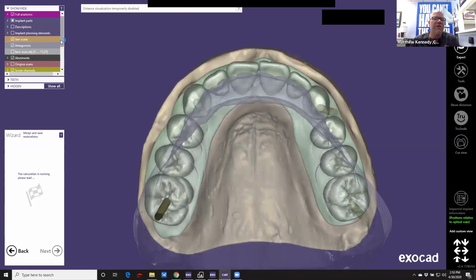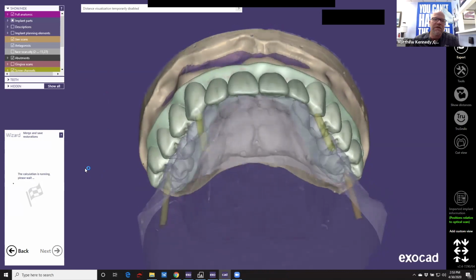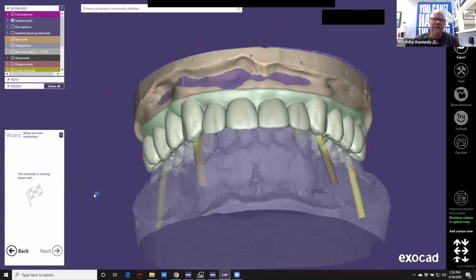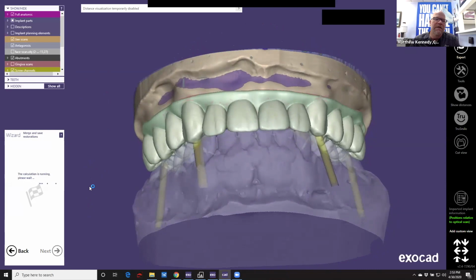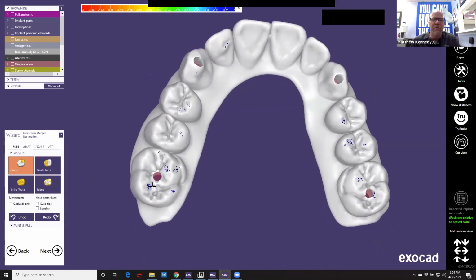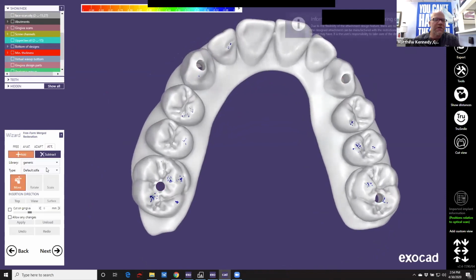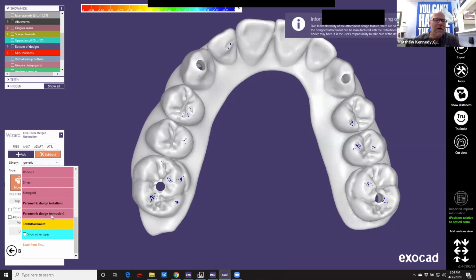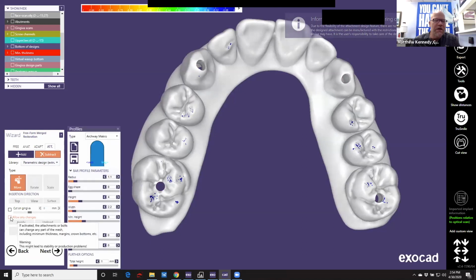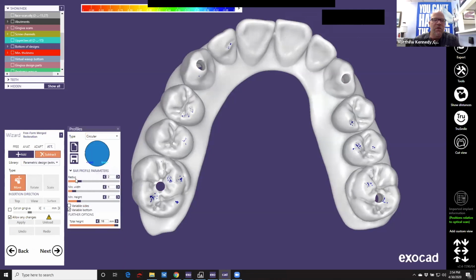You can do that after everything's been merged and saved. That's when you can cut holes and stuff. So hopefully this should only take a second. There we go. Okay, so from here you have your merge construction. I'm going to get rid of my minimal thickness so I don't see it in there. You go to attachments. We're going to do subtract, parametric extrusion, allow any changes. Go to circular, make that thing as tall as you want.